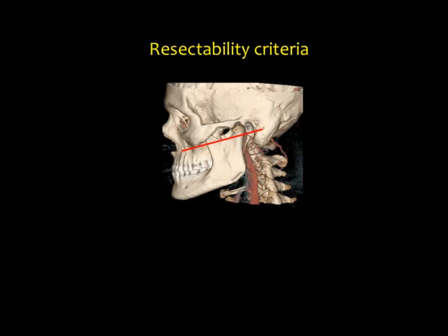If you have any confusion, like if you kept the neck tilted, the cut of the acquisition may be different and the notch appears altered, depending on the angle at which you acquired. But on the sagittal, the notch will not get altered at all. So if you are in doubt, take your cursor on the sagittal and see whether the disease is going above that level or not.